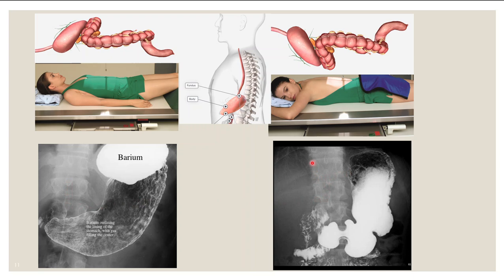We can find a vertebral body here. We can find spinous processes centered down the vertebral bodies. We can see the ribs coming off of the vertebral bodies laterally. We can find those pedicles equidistant on each vertebra, the right and left pedicles. So we can see that these patients were positioned without any rotation.